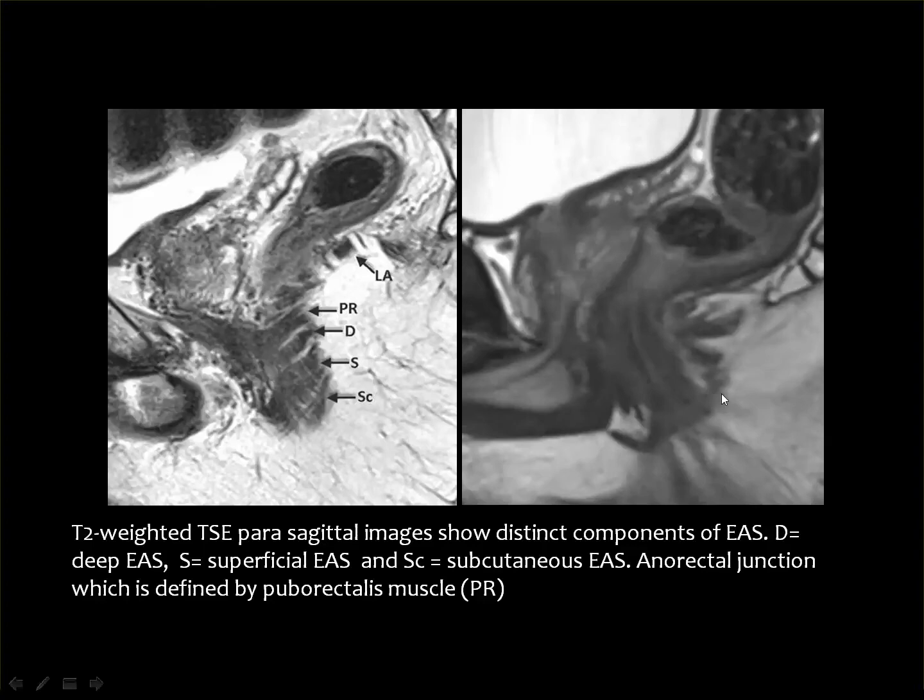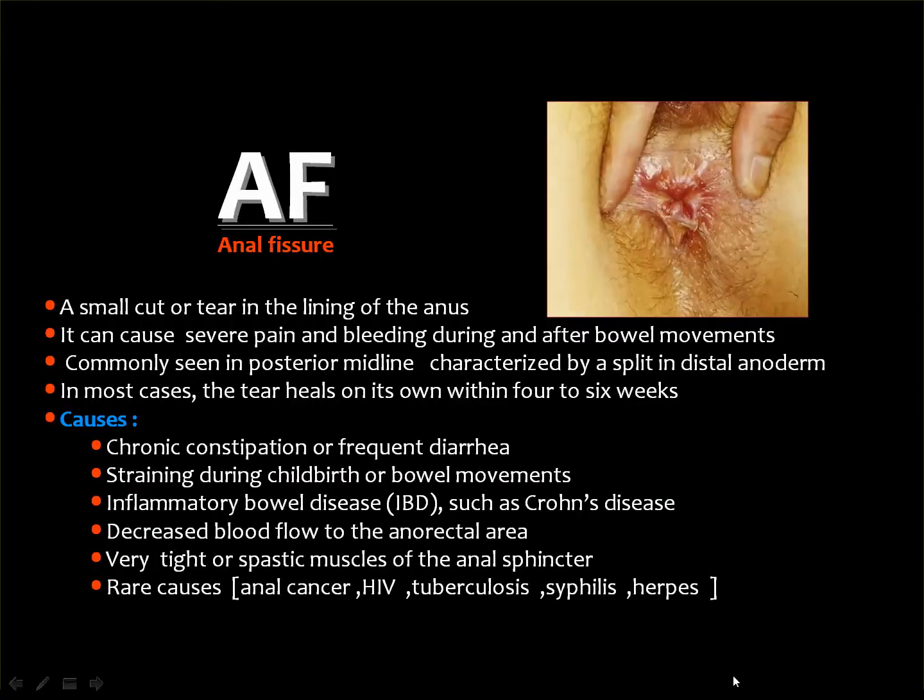You may feel that you got some difficulties looking at the sagittal image, but after a while you will see it's very beneficial in evaluation of different pathology in this particular area. Then if you look at this muscle going away from the rectal wall, this is the levator ani, and here you can see the site of the levator ani.